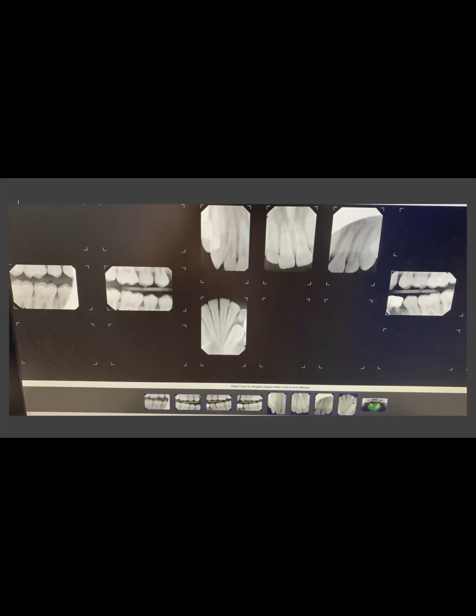An 11-year-old was referred to me for extraction of tooth number 74. The child has been described as uncooperative, has extreme dental anxiety, and runs out of the chair. He reports a little bit of buccal swelling, and intraorally there is a buccal fistula associated with the site of tooth number 74. Can somebody describe what he sees?